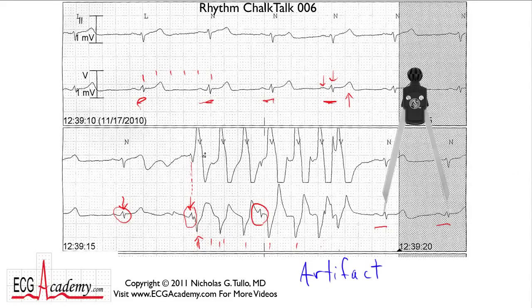Well, this first signal here started on top of the QRS, which physiologically can't happen. You also have a regular QRS in the middle of it, and you can't have a regular normal sinus beat sandwiched between two beats of ventricular tachycardia. It just can't happen. So keep this in mind when you read the strips, because I promise I'm going to show you more of these artifactual strips.